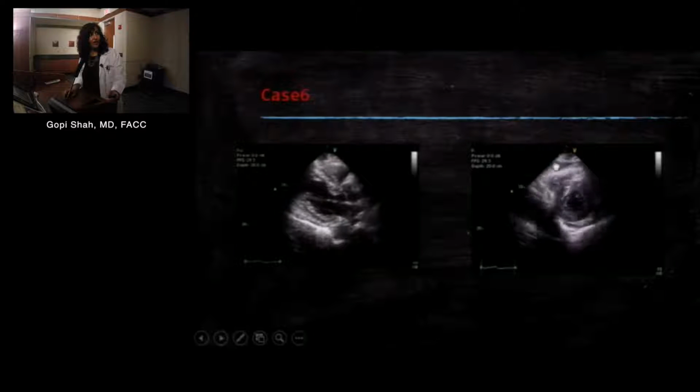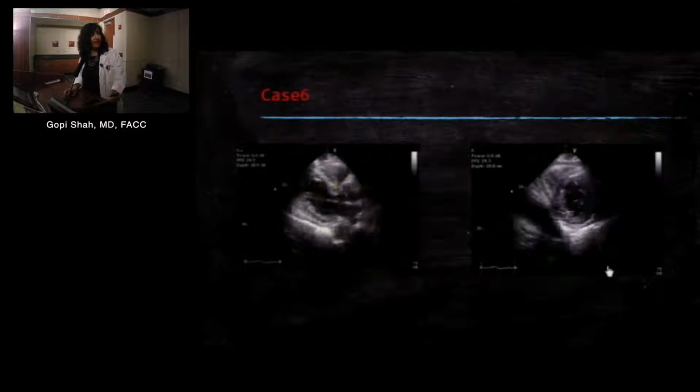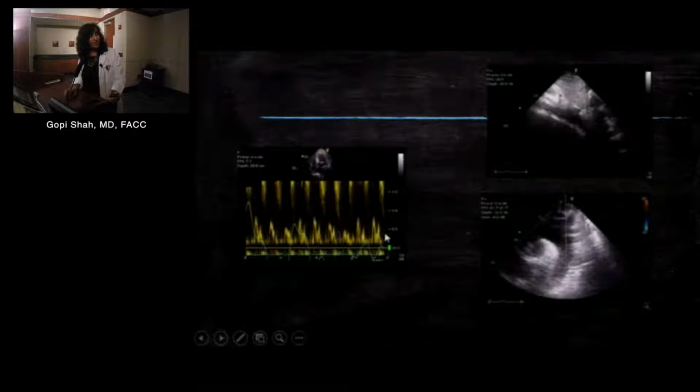Again, just to show how the RV is coming in here. There was respiratory variation, but not the best Doppler. This is a real scenario, so you see what you get, and they put some Doppler. Honestly, on this Doppler in the suprasternal notch, there was nothing again concerning.